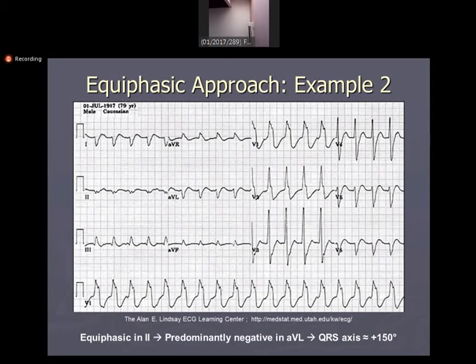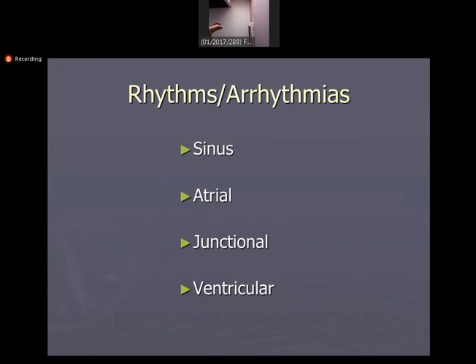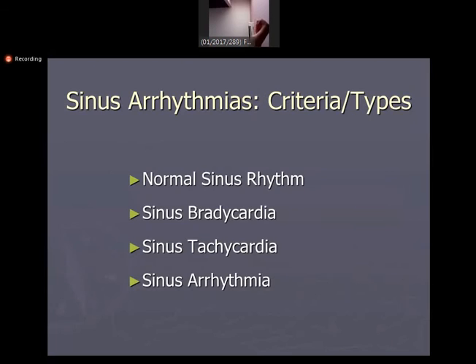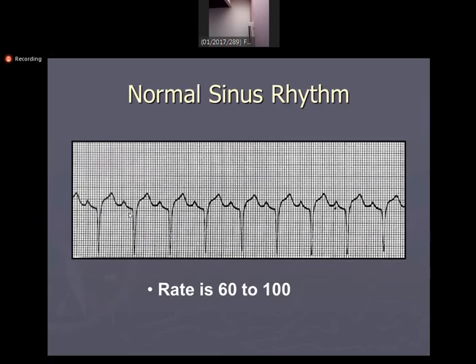Now, up till now, you can understand what sinus rhythm is and how to calculate the rate. Now, the rhythm. What is rhythm? Rhythm means that a certain process occurs at a constant interval.